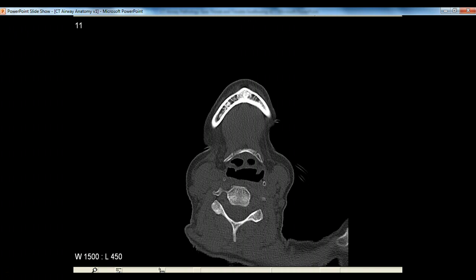What does obstruct the airway is the nasopharynx, with the soft palate that falls backwards and obstructs it, but you've still got an open oropharynx. And in the oropharynx, it's the epiglottis that falls back and actually obstructs the airway. So if we do a jaw thrust, if we do a head tilt chin lift, and we pull up on that bright white bone in the front there, that's the mandible, the jaw, that's attached by ligaments to the hyoid. We pull the hyoid up, we lift the epiglottis up, we open the airway. So when you're opening an airway, think about exactly what you're trying to do, and what you're trying to do is move that hyoid forward so all the other soft tissues pull forward.